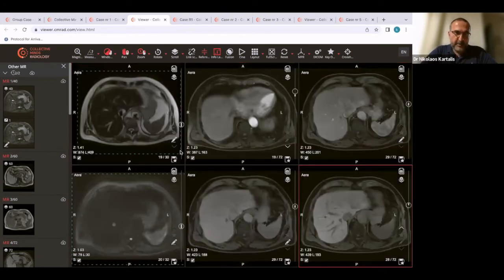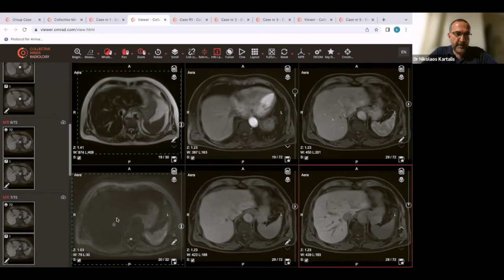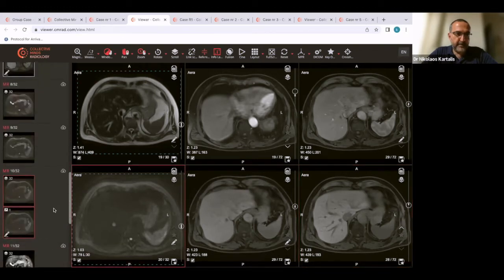So take a look, a few seconds, and I would like Fredrik to show the first question, if it is possible. Yes. So what is the most likely diagnosis for this patient? Is this a hemangioma? Is this a metastasis? Or is this intrahepatic cholangiocarcinoma or an HCC? So take a few seconds to think. I will show you, as said, we need to use diffusion images together with the ADC map. So I will show you the ADC map on this image before you vote.